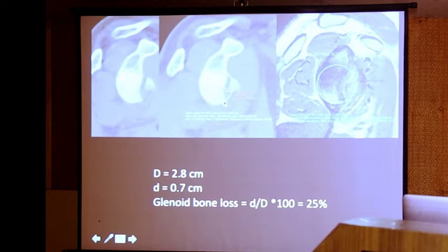Now one thing which can be confusing is, if you can see there is a mild amount of extra osseous bone in the inferior side, which is some amount of osseous remodeling. That osseous bone should not be considered when you're drawing the circle. So these extra osseous prominences should not be considered because they are post-injury changes. So excluding those, I have drawn the circle.